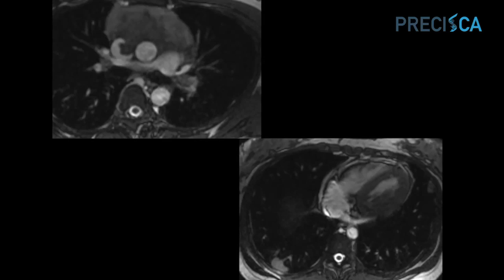So we have an anterior mediastinal mass. The anterior mediastinal mass is exhibiting signs of malignancy. It's wrapping around the vessels like a lymphoma, and it's invading the superior vena cava. Our experience has been that when we have this caval invasion, it's much more typical of a non-Hodgkin lymphoma. And to be quite honest, it's much more typical of a B-cell lymphoma. So with the MR, we were able to look at these images and to offer the team that we were highly suspicious that this anterior mediastinal mass was a lymphoma, likely a B-cell lymphoma, and that's what it turned out to be on biopsy.